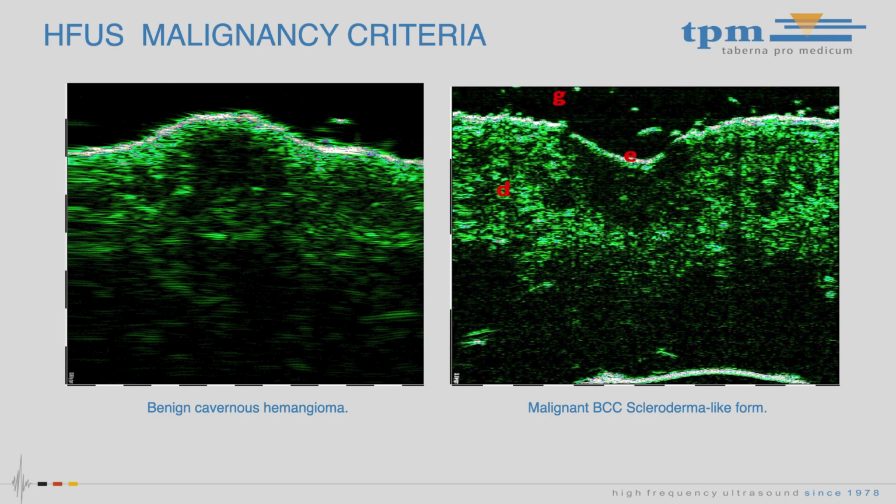High-frequency ultrasound malignancy criteria. High-frequency ultrasound scanning provides a simple malignancy criteria for skin tumor diagnosis. The most informative malignant signs are the tendency of constant growth, uneven irregular margins, vertical growth orientation of the tumor, and increased vascularization during the Doppler imaging. If one or more malignant signs are found, the tumor can be preliminarily classified as malignant.